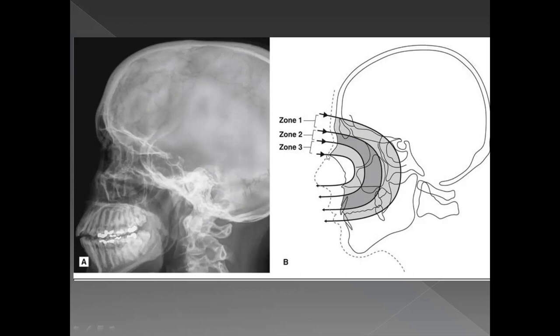Like I said, since the nasal bone is a thin bone, if you maybe underexpose the X-ray a bit, then you might be able to see the nasal fracture more clearly. But since you're doing this basically for the calvarium and the sinuses, those areas will come out very white. So this is somewhat an overexposed X-ray, and that's why you might not be able to appreciate the nasal bones very clearly in this.